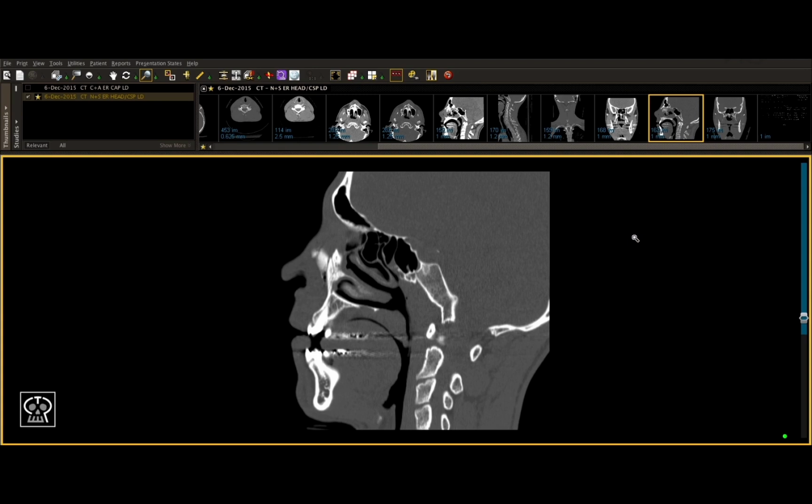It's now time for you to practice identifying fractures in nasal bones. However, as you'll notice, the most important thing when regarding the nasal bones is to get used to regular anatomy versus abnormal anatomy. Therefore, going forward, you'll be asked to examine the nasal bones on every CT scan you look at in all future modules. Always make note of whether or not there is a fracture in the nasal bones, and make sure to include this in your report when you're doing your practice scans going forward.